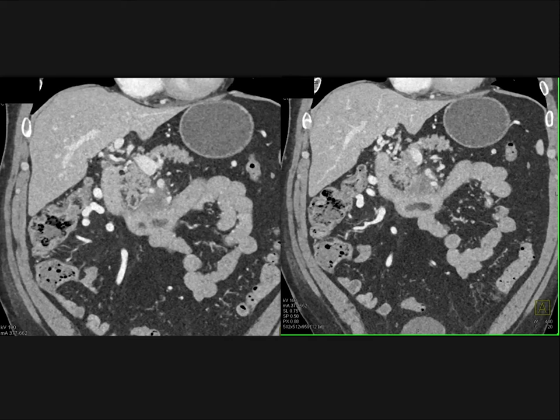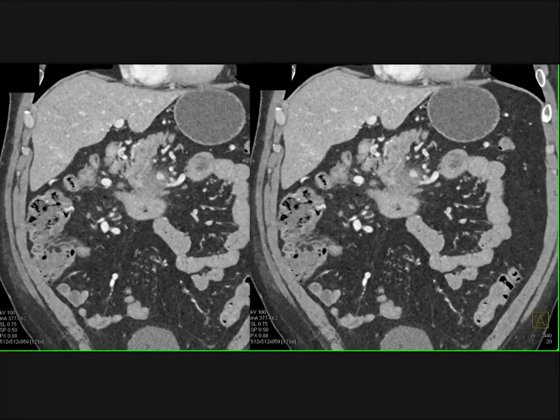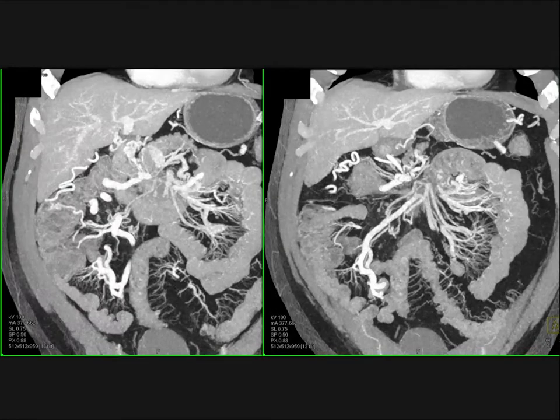So I've seen that a number of times. Direct involvement of the pancreas. And you can see it's really by the uncinate. There's involvement of the GDA. There's involvement of the SMA and the SMV. So sometimes it can be very tricky. You may need a biopsy to prove it. This one, I have to admit, I probably would have thought of it as adenocarcinoma, and that's probably what I would have said. But you're not always going to be right. And look at the collateral vessels. When I see vessel invasion, that to me more likely is pancreatic adenocarcinoma, but that's not always going to be the case.